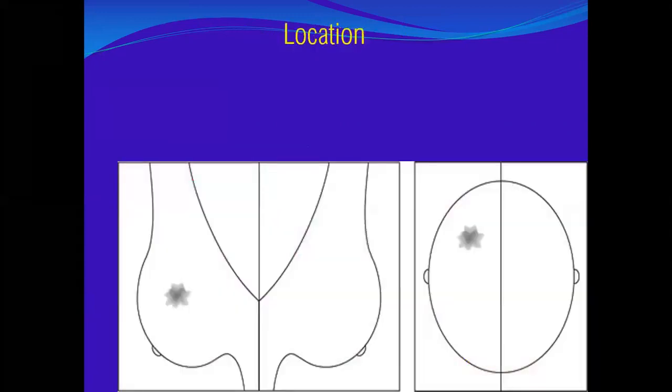Sarah, are you there? Yes, I'm here. Just localize for me this. What is the type of asymmetry in this schematic view? This is a focal asymmetry. Excellent, focal asymmetry. Just localize it. What is the location? Upper outer quadrant. Okay, this is by the quadrants. So the location can be described by quadrants.